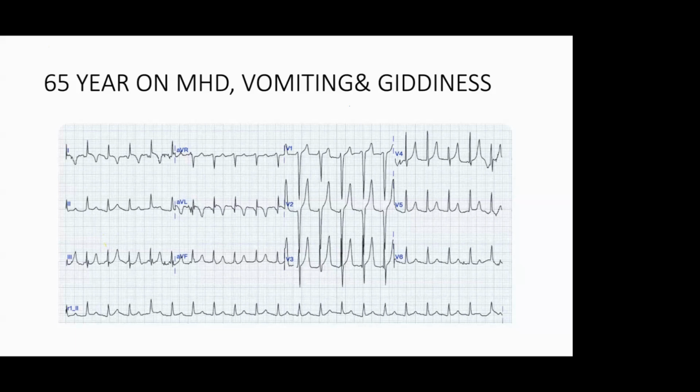This also looks like hyperacute T waves. What are the things we use to rule out hyperkalemia hyperacute T waves? This is an upright T wave only.